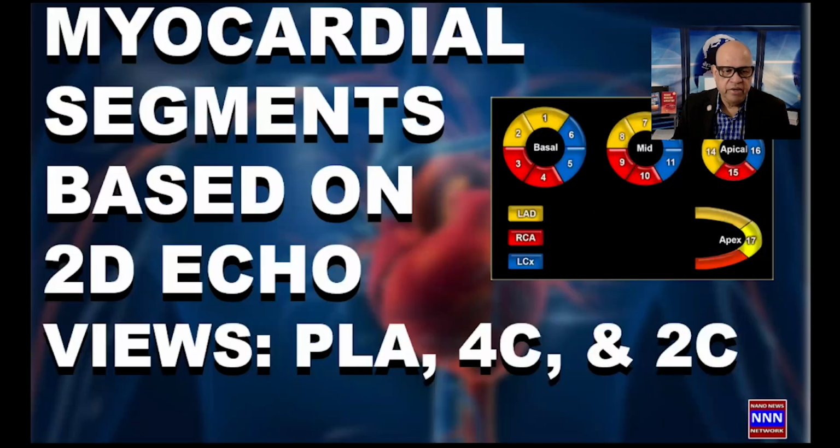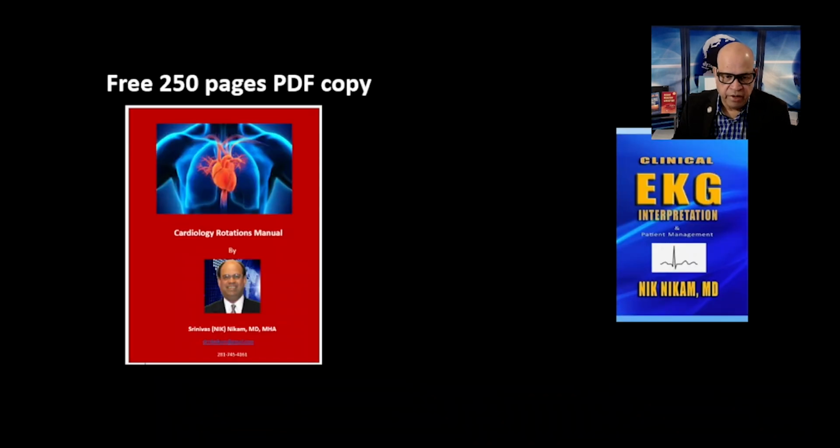The feature presentation is myocardial segments identification based on 2D echo views, namely parasternal long axis, 4-chamber view, and 2-chamber view. This becomes extremely important in identifying areas of myocardial ischemia or myocardial scar or paradoxical wall motion, as well as in stress echocardiography to identify the regions that may have problem with wall motion abnormalities, thus helping us to identify the coronary anatomy that is involved in the region of myocardial dysfunction.